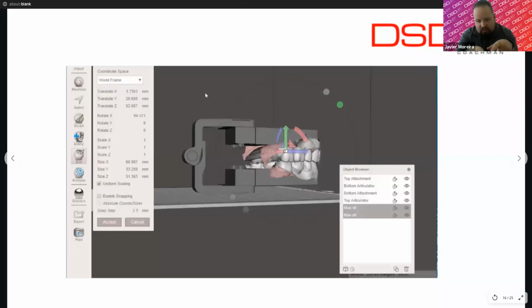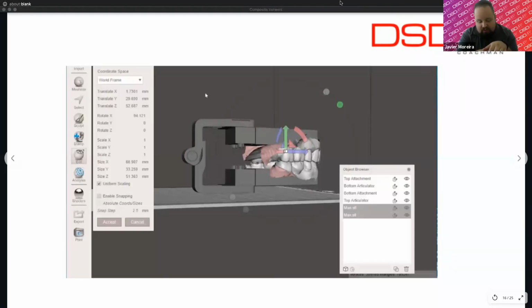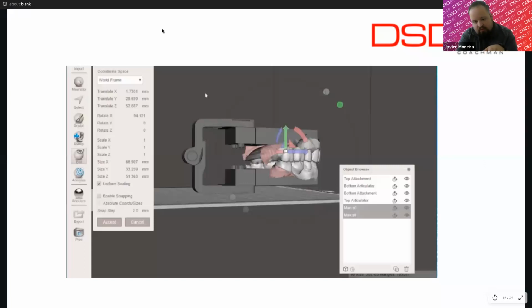This is actually being used in Meshmixer, where you would align the designed upper onto this tool, and you would align the original lower. And with this, you can actuate one on top of the other and check the occlusion within the app itself without intersecting. Joe, if you can go to the next one.